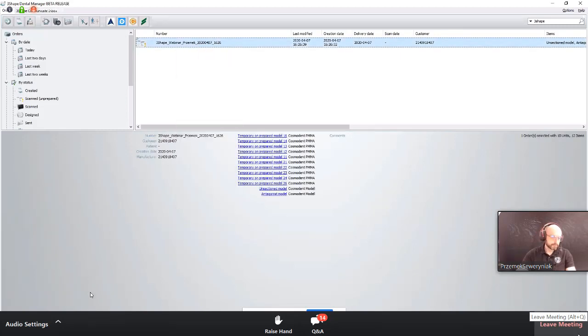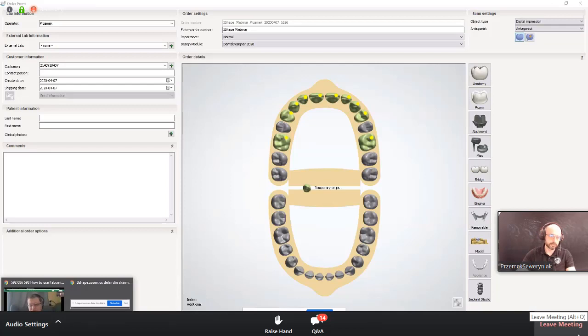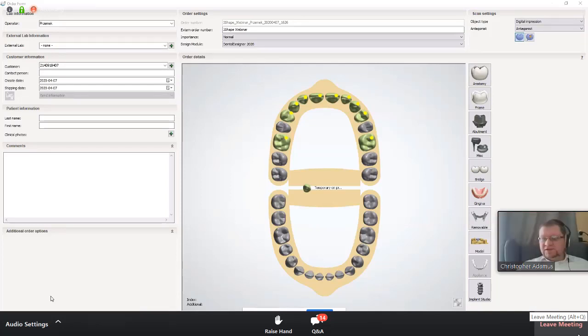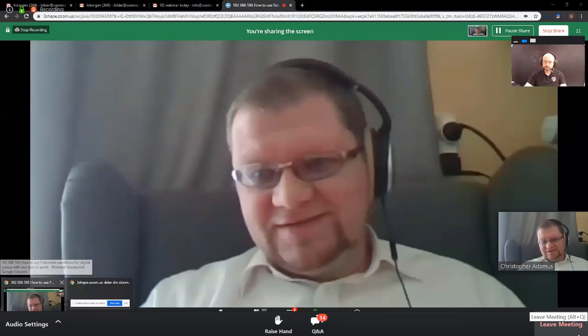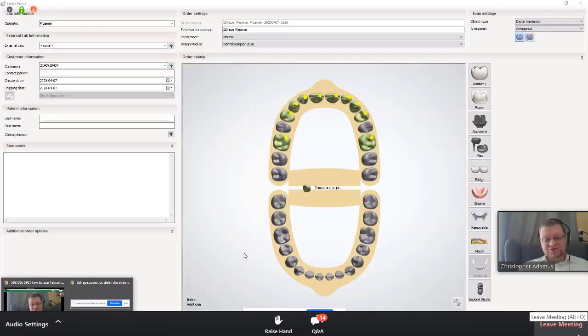More questions? Well, there's a question if you can do a mock-up based on it. Yeah, that's what I'm going to do now. How will the superimposition look? So can you actually superimpose? Yeah. I guess that you will show this one as well.